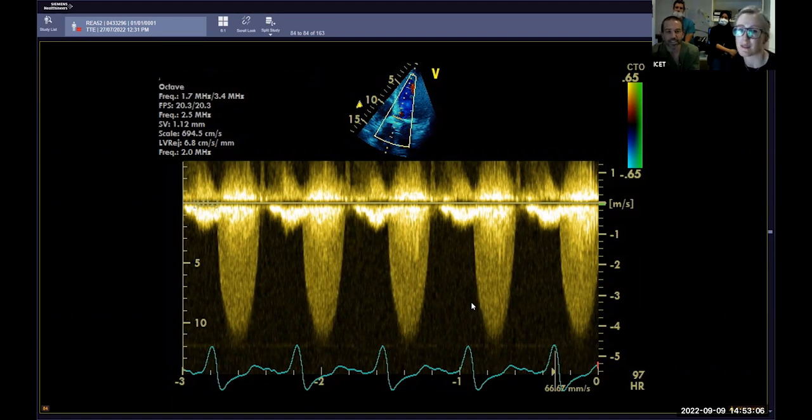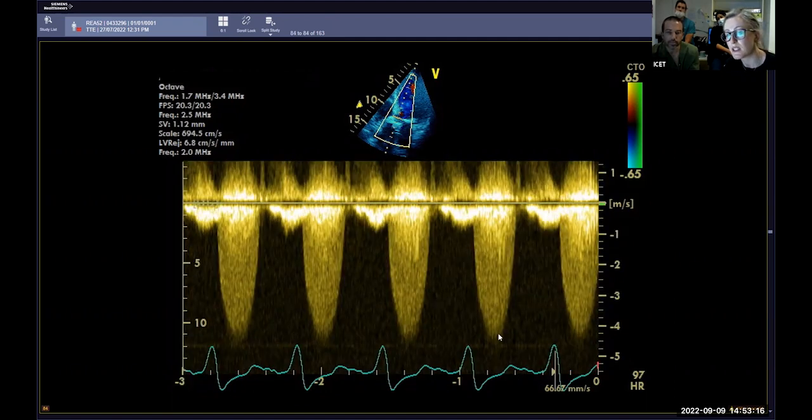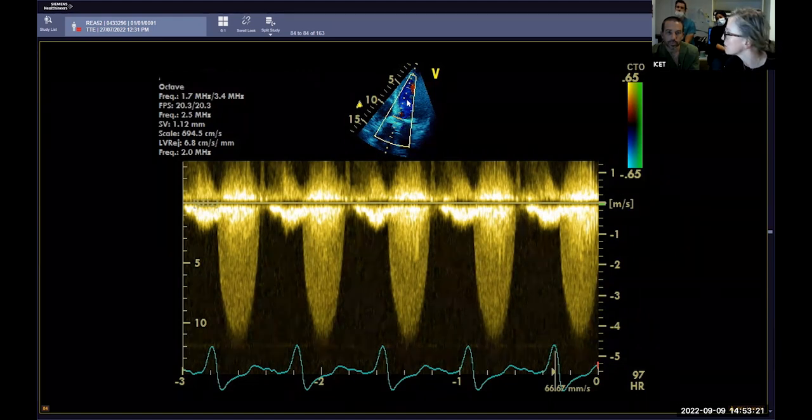With mitral regurg, it becomes more triangular because you get that V cut off. That's right. Does it surprise you? Because I must admit, when I look at these peak velocities, seeing the degree of LV systolic dysfunction and the degree of mitral regurg, I was actually surprised that we were getting high gradients. I was thinking, oh, this is going to be low gradient aortic stenosis, right? But it ended up being a gradient so high, which isn't good. Which is terrible.